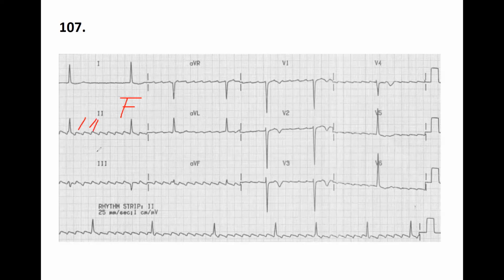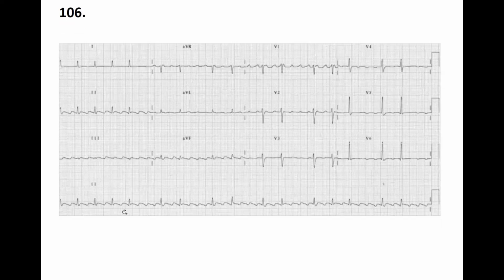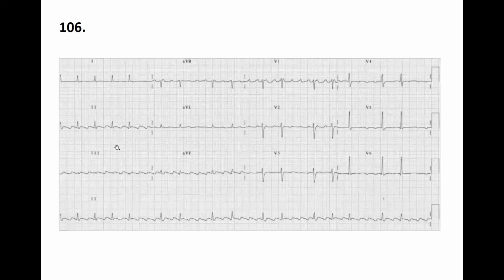This looks like an atrial activation with a certain pattern, and maybe every eighth or every fifth or every certain beat is going to conduct. Such as here is a slow one because that's a bradycardic one, but still an atrial flutter. Here, a little bit faster, it's changing from 2 to 1 to 4 to 1, and this is arrhythmic. So a flutter can be rhythmic or arrhythmic, but you do see these flutter waves, okay?